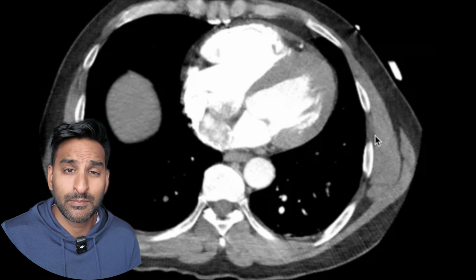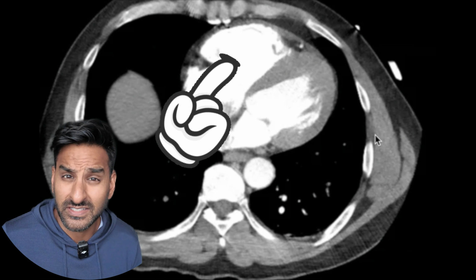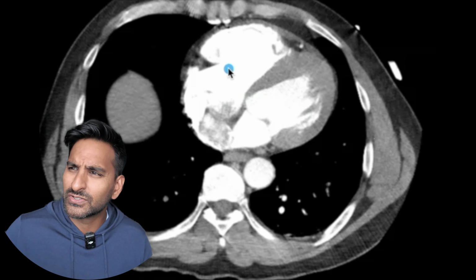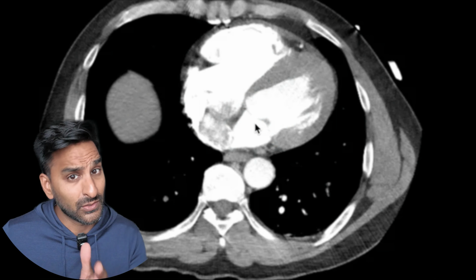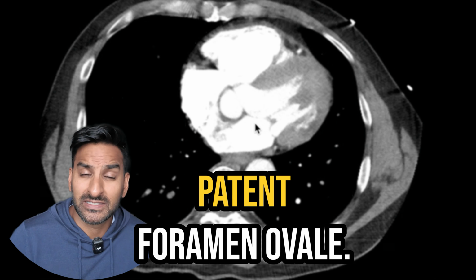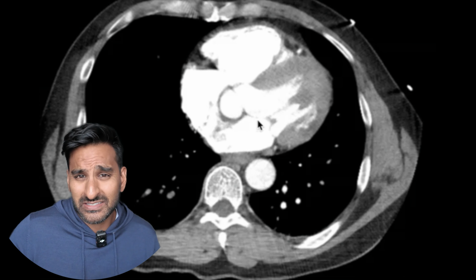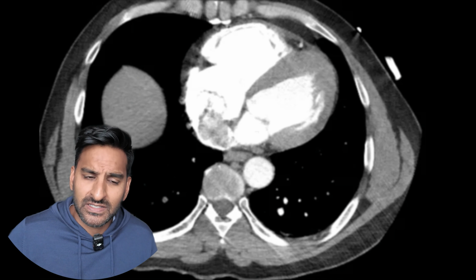Now, when you're doing a CT pulmonary angiogram, you'd be expecting the contrast to be within the right ventricle. But in this situation, you've also got contrast on the other side; it has gone on one side and crossed the border and gone to the other side. Now, the other way that can happen is something known as a patent foramen ovale. Usually that's not too big of a deal. Most people can survive with it. But this one is different in this situation.